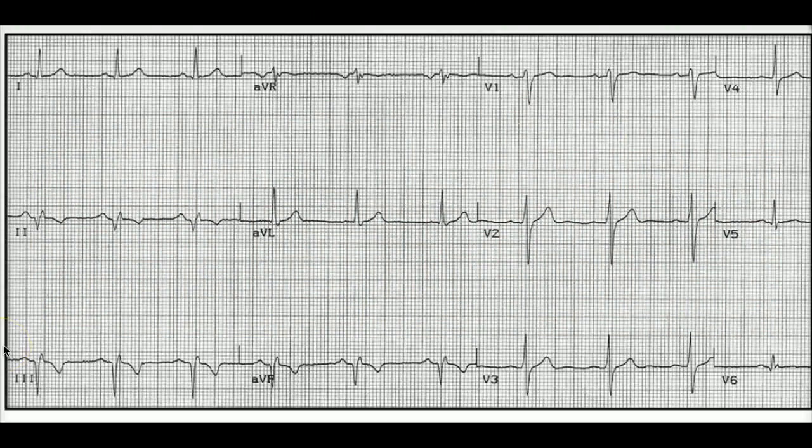So this is our last example for our Q wave. We can see that in lead 2, they're starting to build our Q wave. Lead 3, whoa, look at how big these Q waves are. Again, an old infarct. And we should also see that in aVF. So whenever we're looking for Q wave, I usually look at 2, 3, and aVF. But we also see Q waves in other portions, depending on where exactly the infarct is.